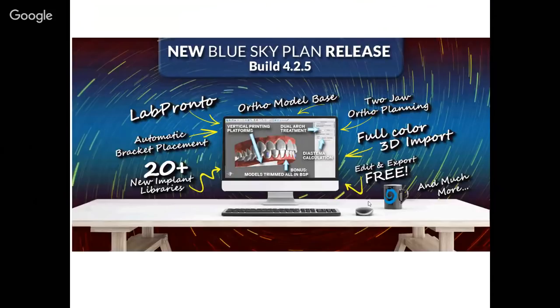We also have made the possibility of editing different surfaces such as CT and STL and exporting them from Blue Sky Plan after editing them at no charge. And that's going to be relevant for today's presentation. We're going to see in just a minute. So you could go ahead, you could load different surfaces, you could invert impressions, you could cut models, you could add bases, you could convert CT to an STL. You could do all of that stuff. You could export it from Blue Sky Plan at no charge. Until you create a surgical guide, exports are free. And that's going to be important. We're going to see that in just a minute in today's presentation.